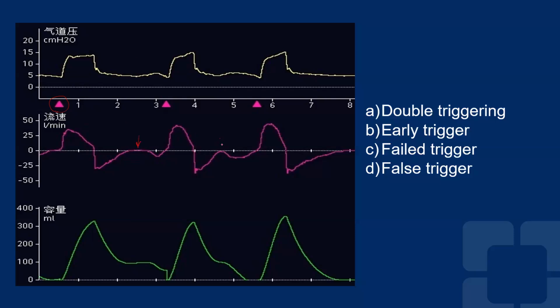And immediately what you will see is that the initial step up in pressure increased massively. And then just to confirm it, you see that now from peak to plateau, instead of being this amount, it is now this amount. So to confirm it, I go and look at the expiratory waveform, and although these expiratory waveforms have some aberrancies, it's much longer than the other one.